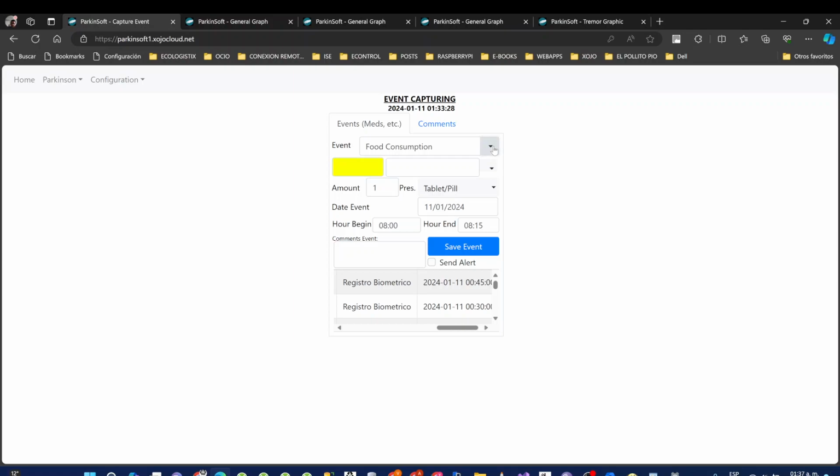Consultation or study. Always, as soon as you receive the date and time of the next consultation with a doctor or studies procedure, the event must be programmed in the application. These events will be displayed on Apple Watch's main screen showing the next upcoming event.